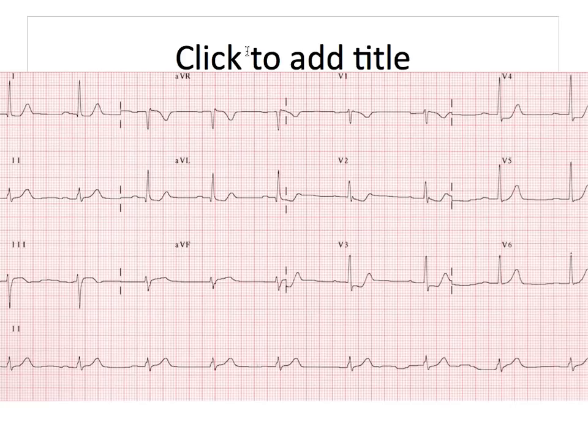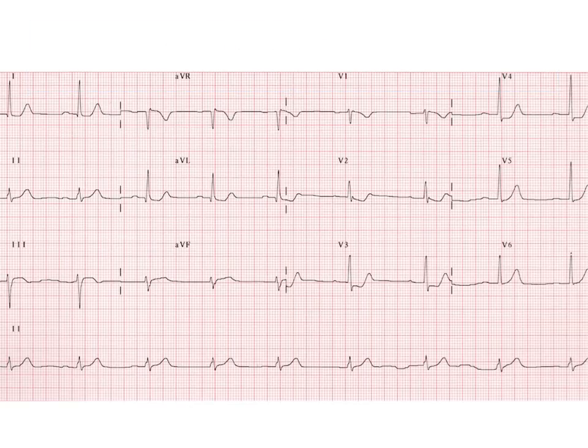So here's another one. I should have deleted this little thing up here. I'm sorry. Here, I can just do that right now. Look at this. We're editing on the fly. Perfect. Done.